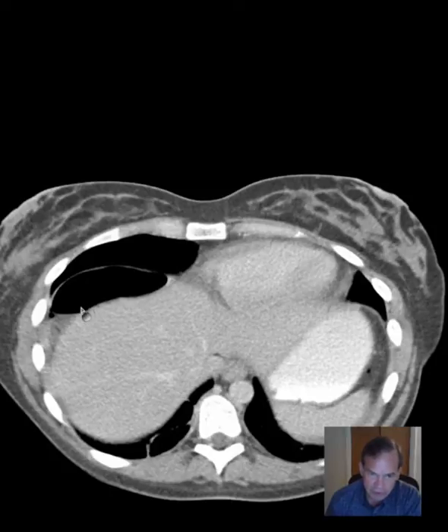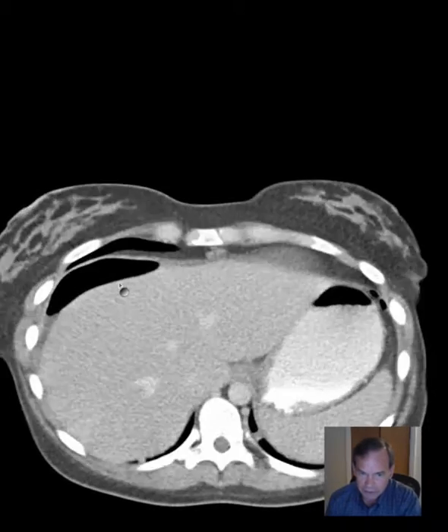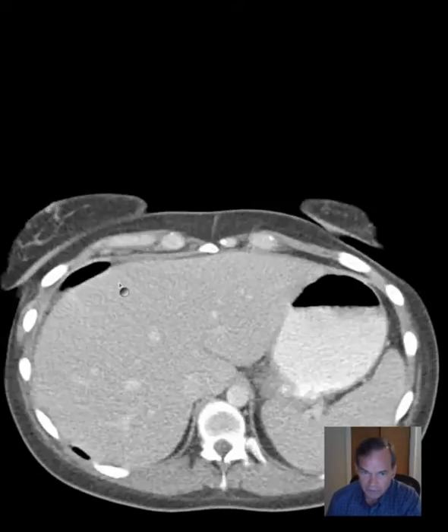It may be a loculated collection, but this is what we see when we see free air intraperitoneally that we identify as free air under the hemidiaphragm on an upright KUB or an upright abdomen. Here we're seeing fluid level within this area of the peritoneal cavity. So that's actually within the peritoneal cavity, but outside bowel.